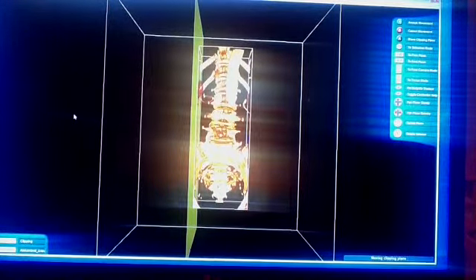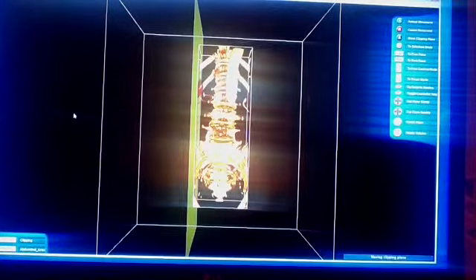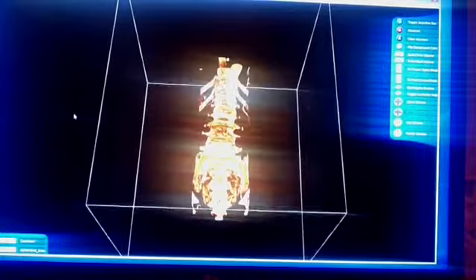Now what's best is to go to the examiner mode to look around on the back side, and it'll show more of the backbone. So we'll go to what's called the examiner mode, where we can manipulate the image. So now we're going to look at just the backbone. And in fact, I think we're better off looking at it at an angle, like that.